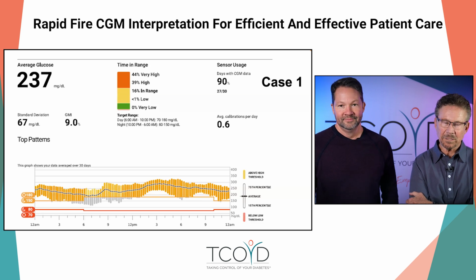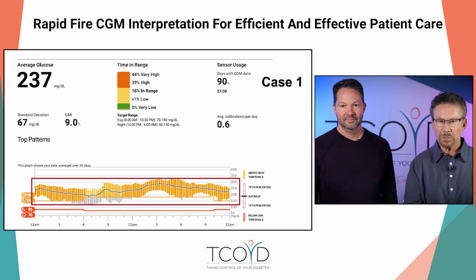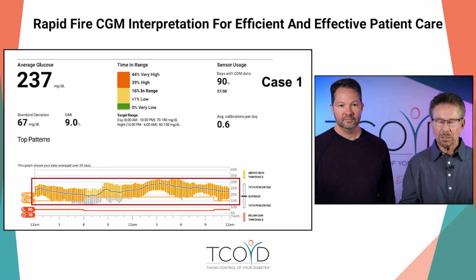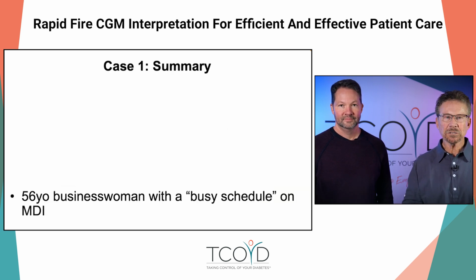Well, you did a nice job, buddy. I think you nailed it. Let me tell you the details of this case. I put this slide in here to emphasize what you just said: just high all day long. And think about this, if this was down, we wouldn't be that unhappy. Right. Everything would be better. And so here's the summary.